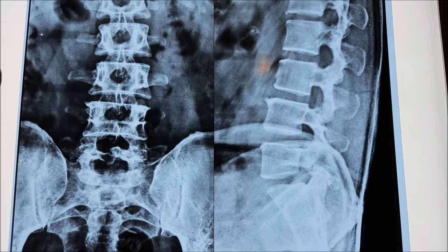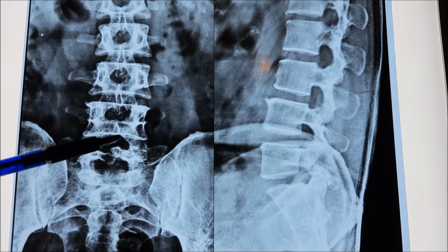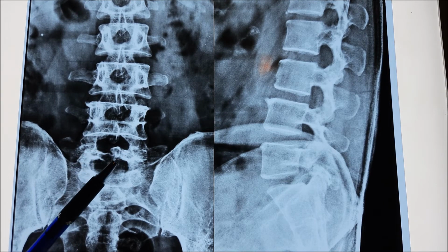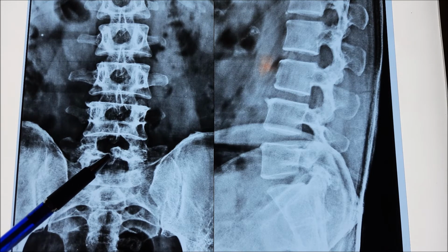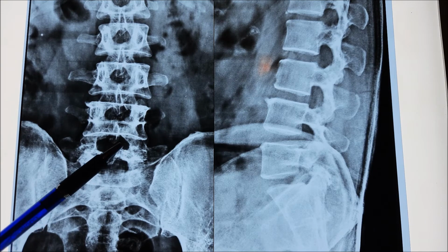So we'll see the spinous process. We'll start with the T12, L1, L2, L3, L4 spinous process. We can see it's quite proper. Then we will see the L5 spinous process. If you just notice it properly, see this, the L5 spinous process is bifid, but it's supposed to be unifid. That means it is having a single face. But you can see again there is a fracture in the L5 spinous process. So that's the second finding from his X-ray. He is having an L5 spinous process fracture over here.